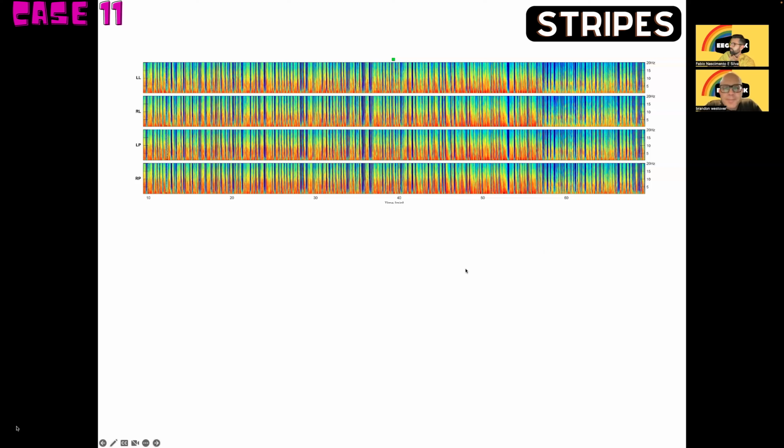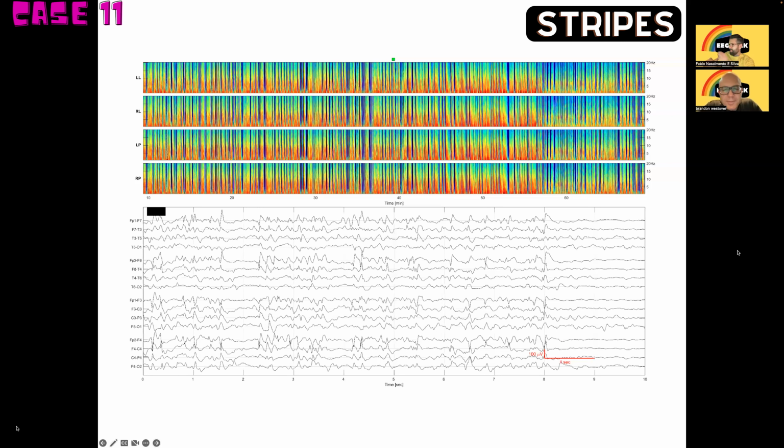Okay. Cool. So should we look? Let's do it. Nice. Yeah, I think we're right. Beautiful. So the burst is longer, right? Yep. And spikier. And the suppression is not a complete suppression. It's still got some background activity. It's not very flat. But I think there's other parts where it's more flat.